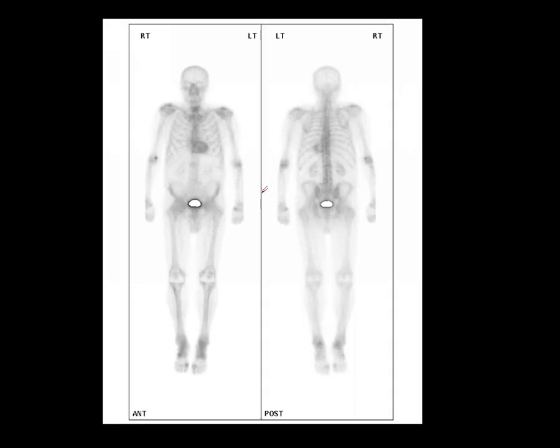There's other conditions where we get soft tissue accumulation of tracer. Here's a patient with activity in the heart. This is a patient with amyloid, and of course you can draw a region of interest around this, usually with a SPECT-CT, and quantify it and determine the extent of any underlying amyloidosis which the cardiologists can find useful in diagnosis.